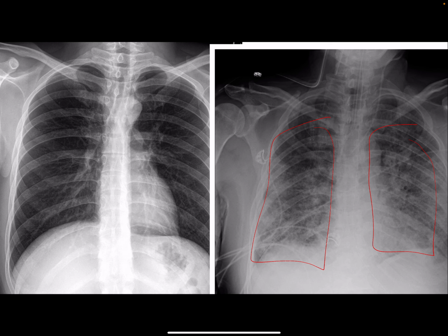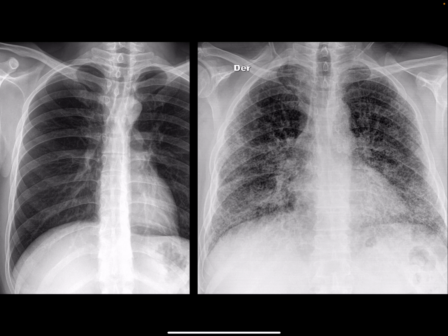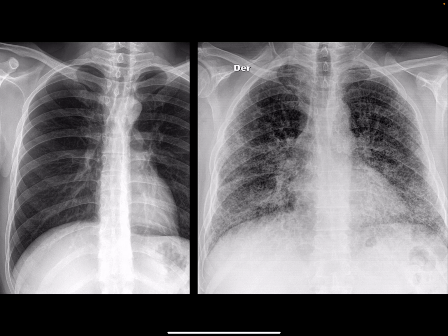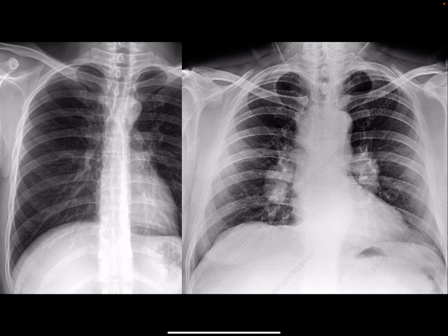not slightly homogeneous, but a little bit fuzzy, a little bit blurry. This is ARDS, acute respiratory distress syndrome. It looks a lot like pulmonary fibrosis, but I think it's really good to differentiate the two. Here we go again. So notice this is ARDS. This is a pulmonary fibrosis, potentially an atypical pneumonia.